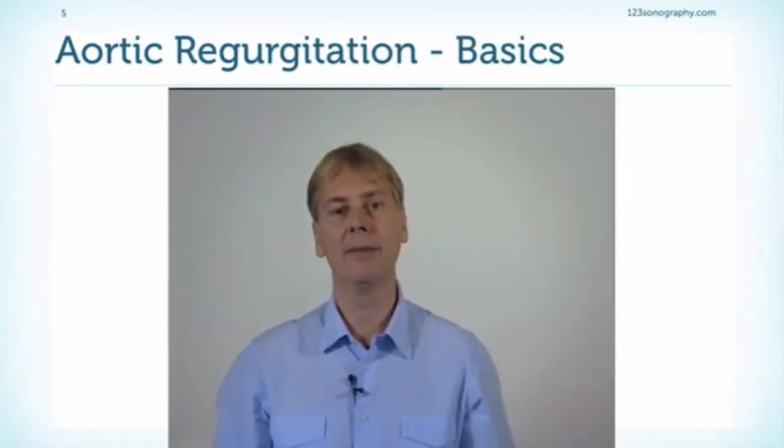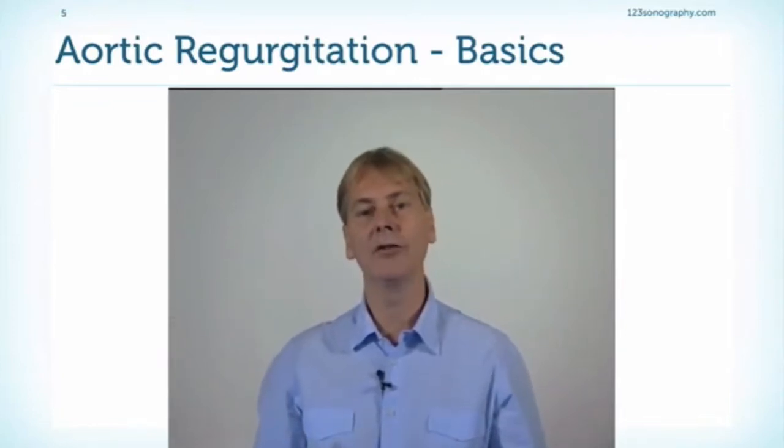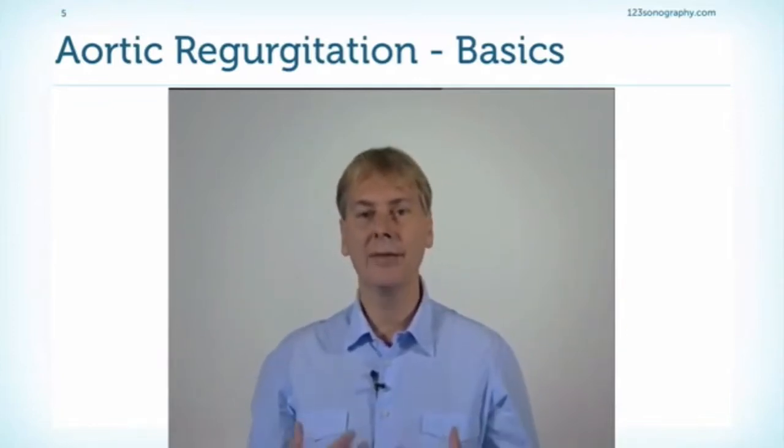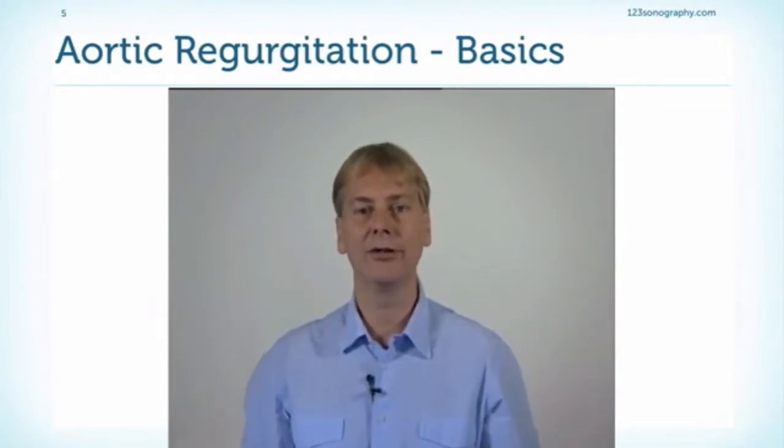Let's first talk about the basics of aortic regurgitation. What are the causes? How frequent does it occur? What are the hemodynamic sequels of aortic regurgitation? And what can we see in the two-dimensional image?